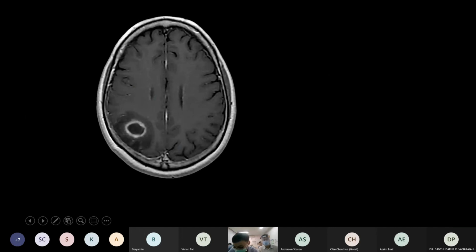So now how about this lesion? Maybe I will just find one volunteer, maybe Benjamin. Benjamin, can you tell me what you see? Hi, Benjamin. Hello. Just a moment, please. Hi, can you hear me? Yeah, I can hear.